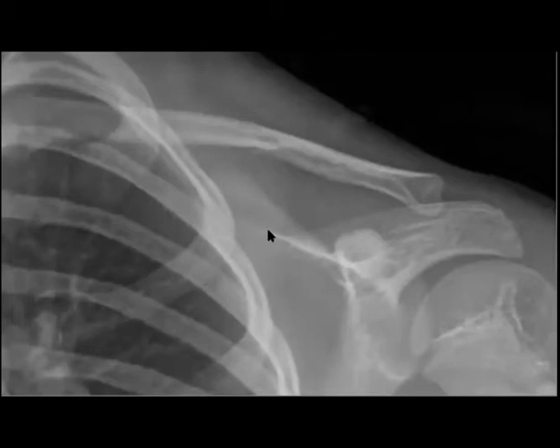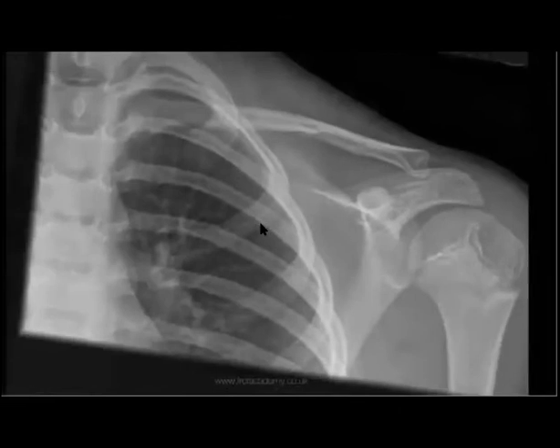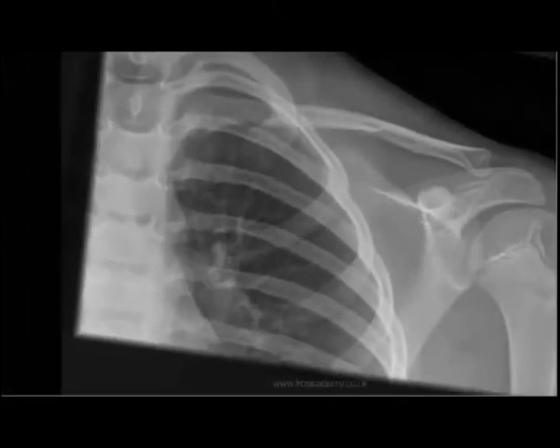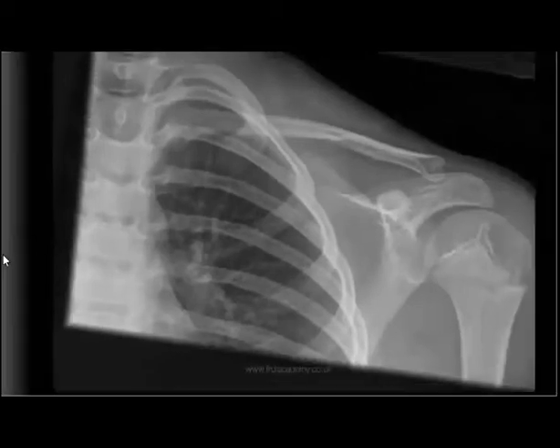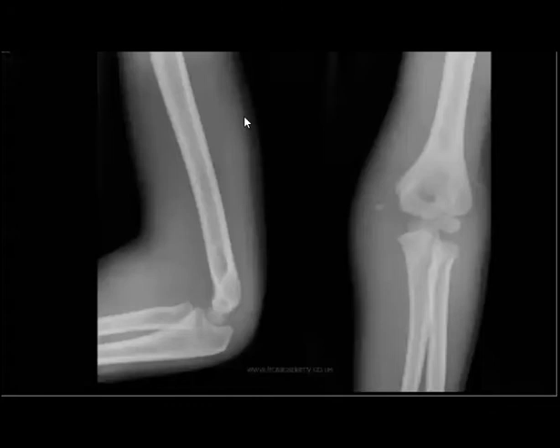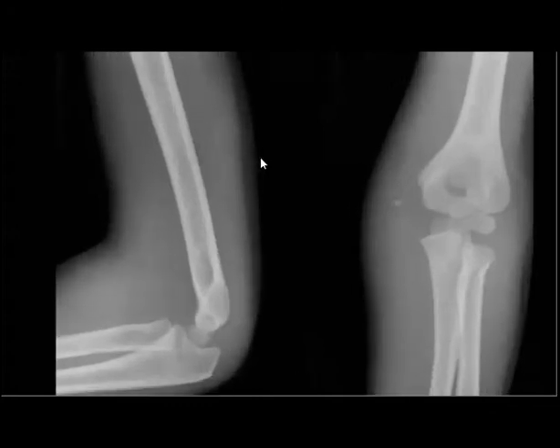Yeah, clavicular fracture. Now, I think this training gives you the point that you should always check the most common location of abnormalities first. Then after that, go further and check slowly for the uncommon.